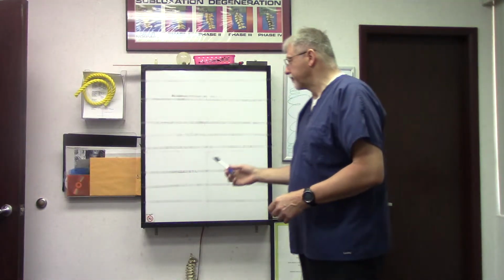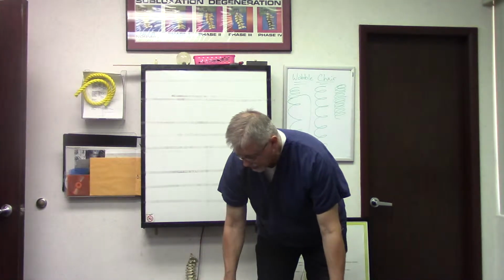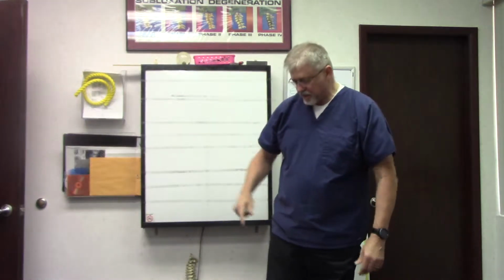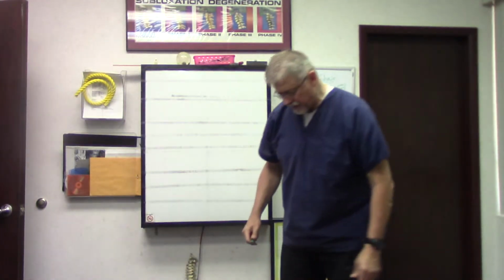Very exciting. So the wobble chair itself, which I have a couple here. One of these has training wheels on it. It's got 2 arms on it. I don't need that. I've been riding my bike for a long time. This is another one. That wobble chair creates the ability to go through a figure 8. That figure 8 is when Dr. Burl Pettibon invented it. He wanted to make something that would assimilate the figure 8 that the pelvis goes through in walking.